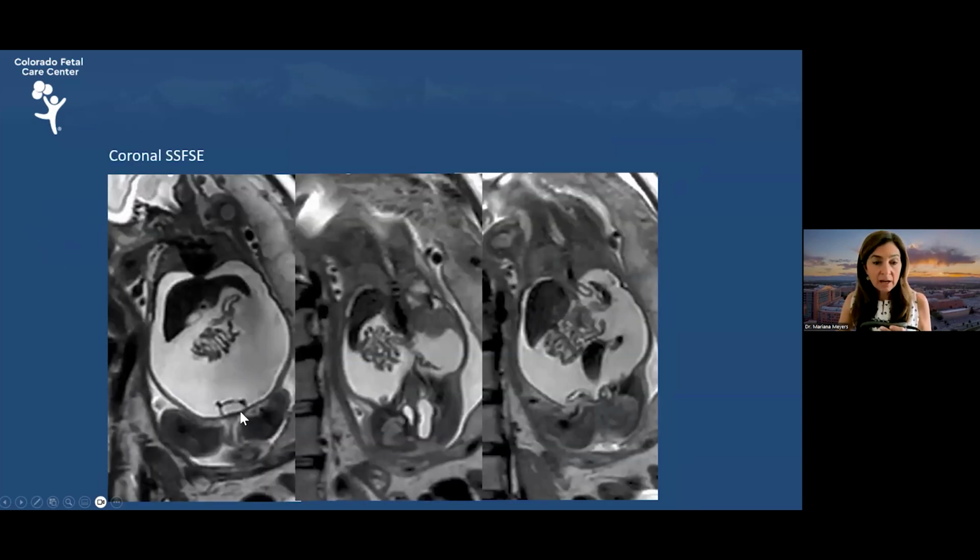This same patient had an MRI, and you can see the bladder with the 2 umbilical arteries here in dark signal, massive ascites. One cut posterior, you see the 2 cystic structures, and this entity coming in between these 2 cystic structures, which has a light gray appearance, and then a little bit more posterior has more hypointense, although mixed, signal intensity, and you have other tubular structures close by.